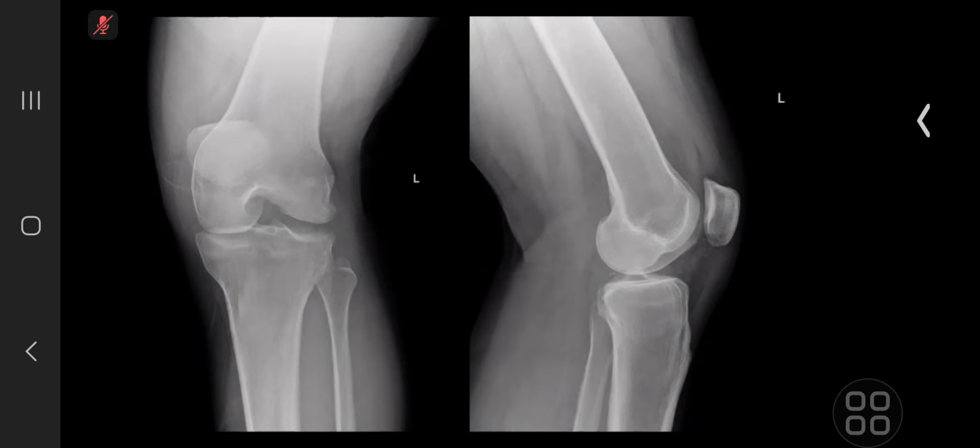There is no blood clotting disorder. Okay. No history. And also on the lateral view, I have noticed in the popliteal fossa, there's a small calcific focus. So that could represent a small bony fragment. Given that the patient presented with trauma and there's the abnormal appearance of the lateral tibial plateau, I would recommend orthopedics review for this patient.